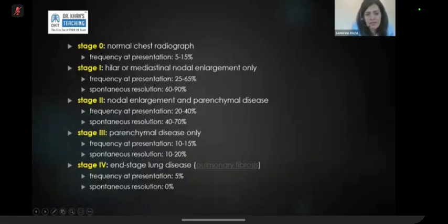Again, reiterating the stages of sarcoidosis, hilar and mediastinal lymph node enlargement is easier to diagnose, and is usually the initial presentation in younger people. And the differential that needs excluding, rightfully so, is lymphoma. Lymphoma is seen in the same age group. The lymph nodes, if uncalcified, can be more confusing with lymphoma. If you see specks of calcification, it becomes easier.